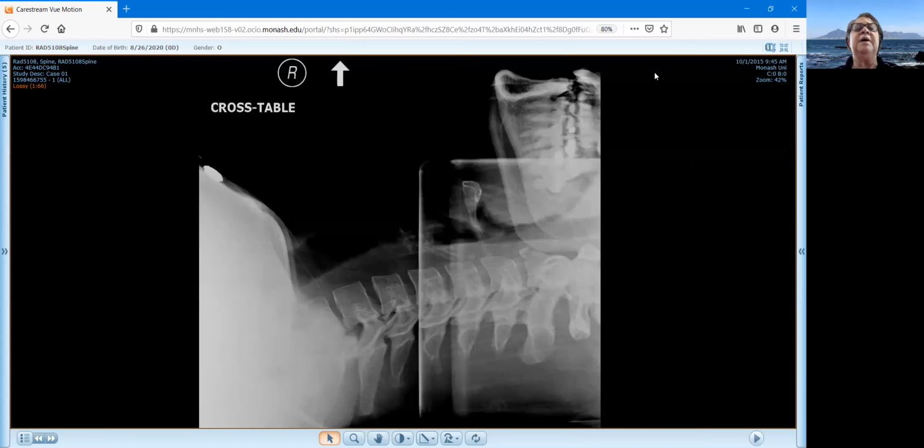This is the feedback on the cervical spine practice bank that I have given you. Please have your opinion form at hand so that you can self-mark as we go along.